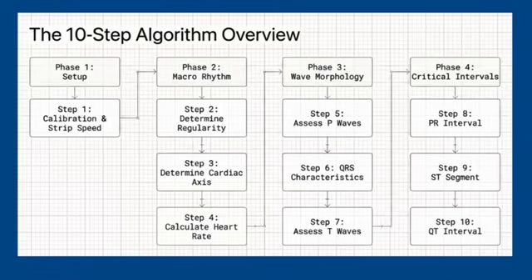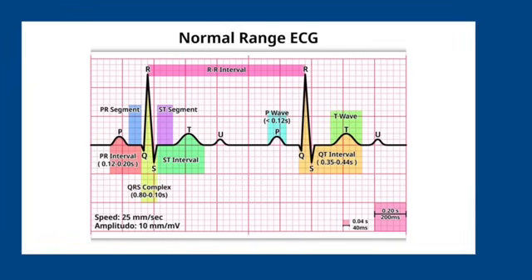If we look quickly at things we learned about the ECG, it is a repetition of the PQRST complex in different leads. The ECG is formed of 12 leads. We have the P wave, which represents atrial depolarization, and the PR interval, atrial depolarization plus conduction in the AV node and AV bundle.